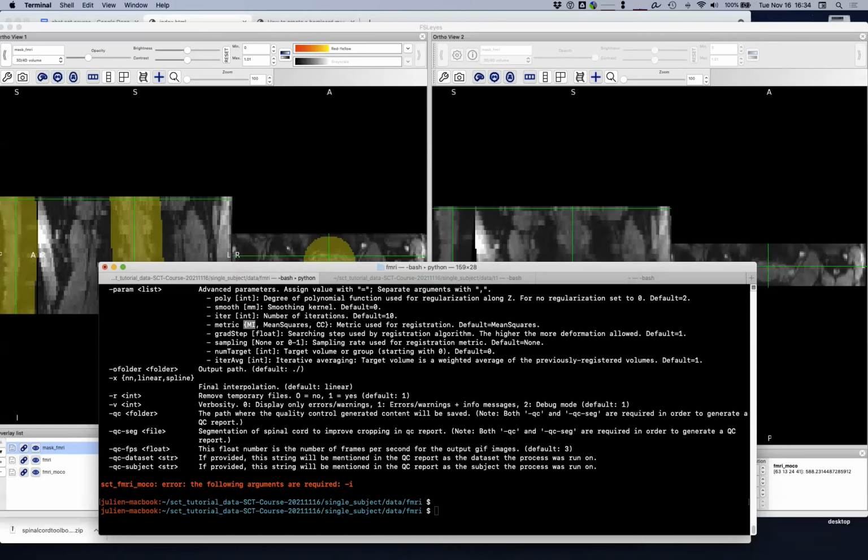So as you just said, I found the best approach was to find that happy medium where it's big enough to actually extend past the bone and include some of the boundary between bone and fat and muscle, but then not much further than that, because then the distortions and whatnot definitely don't help at all. So it's definitely a fine balance. Yeah, that depends on the data as well.